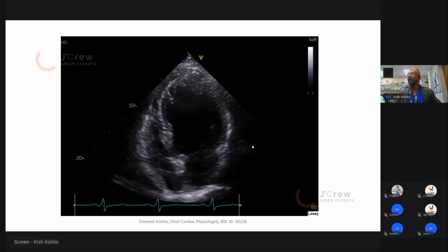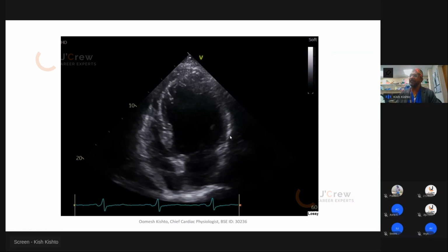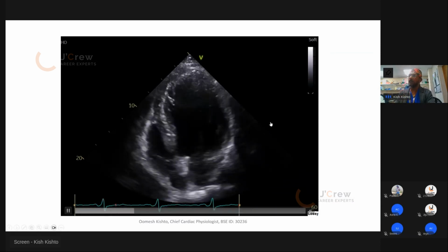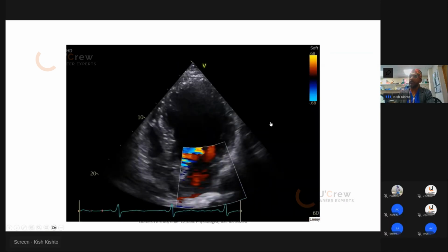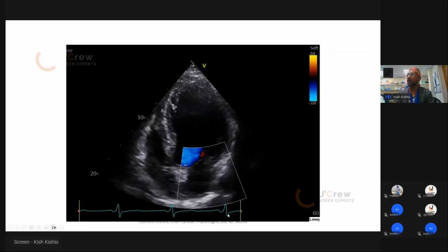Sorry. So again here, you can see it's very dilated and quite balloon. Let's click on this. We don't need these. You will encounter this a lot when you do the mitral valve inflow and your CW, as you can't see your E and A clearly here because of the AR. So if we go back, let's see that.